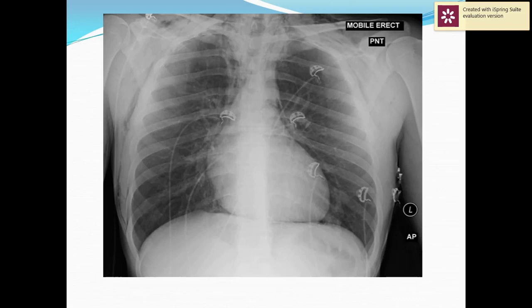He was having history of bronchial asthma and admitted with chest pain, dyspnea, repeated cough. As we see here, there is multiple surgical emphysema, subcutaneous emphysema, also subcutaneous emphysema in the neck, and continuous diaphragm sign denoting there is air retrocardiac.